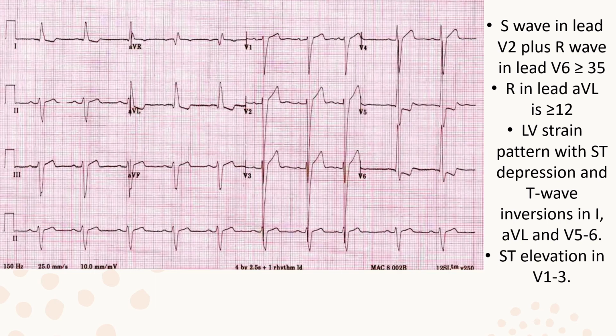Looks to be sinus. There is a bundle. What kind of bundle is it? Well, V1 is negative. V6 and 1 are upright.